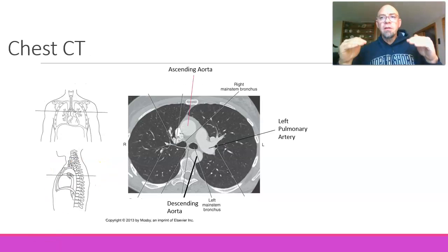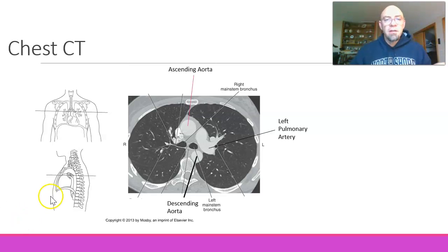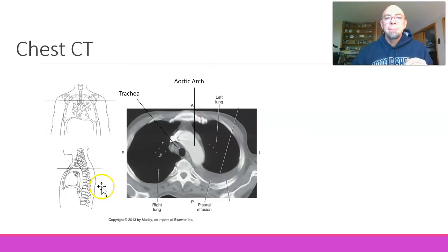All right, we're moving down another level, but I wanted to point something out. This is a great example of a different window level, or a different algorithm, to show the lung tissue. So there is a lung window, I believe. And if you look at the lung tissue, you can see all the vasculature within it. There's contrast all within the vasculature of your lung field. Look at the previous image. You don't see any detail within that lung parenchyma. That's because it's using a different algorithm. It's using a different window level.